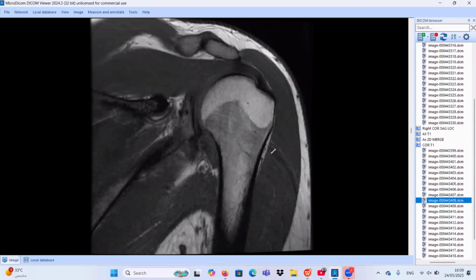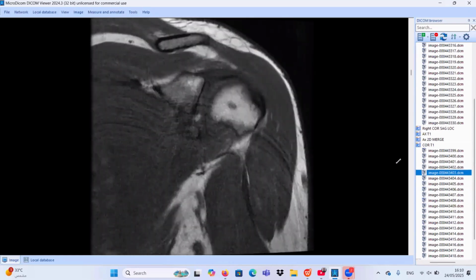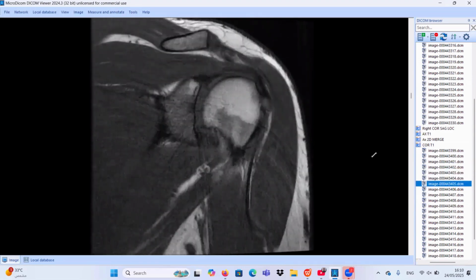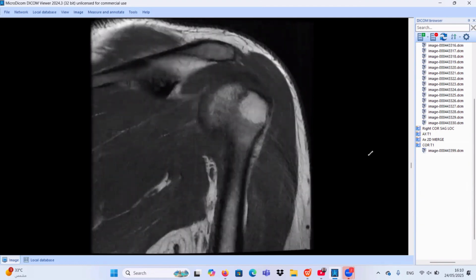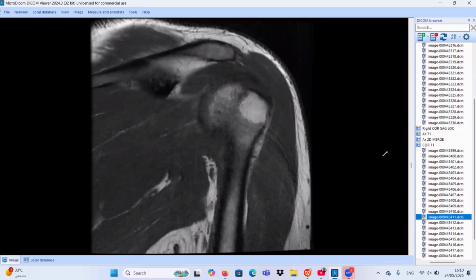I'm sorry, the image is slightly hazy, with motion artifact. I think also the bony fragment is seen and it's separated from the inferior aspect of the glenoid, which is a confirmation of our finding in the X-ray. And also if I can see the Hill-Sachs here in this bony depression, maybe. Okay. Let's go first to the axial T2.